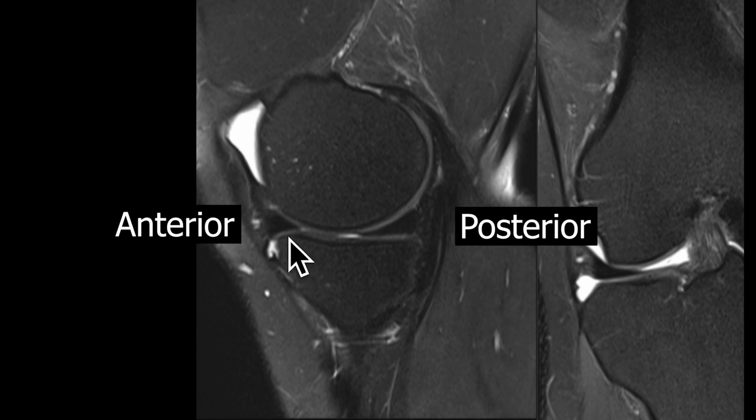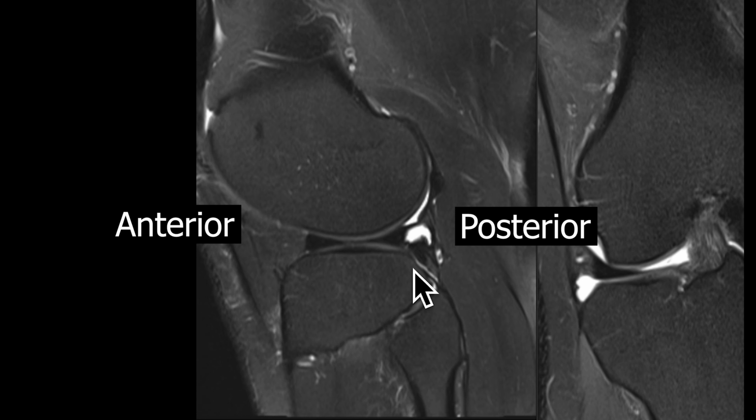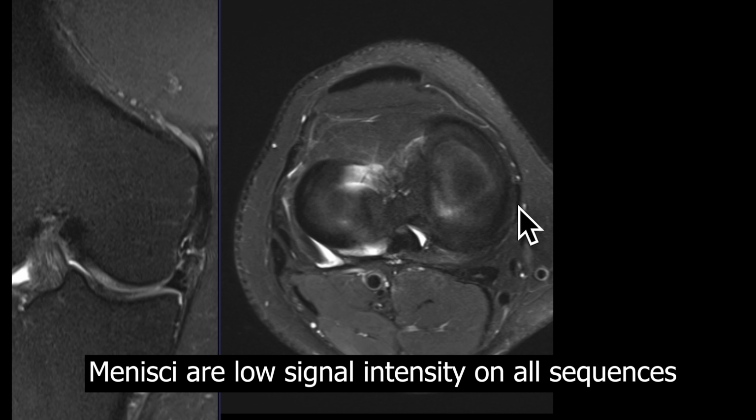The posterior horn of the medial meniscus tends to be larger than the anterior horn, whereas if we move on to the lateral side, the anterior and posterior horns are of similar size. The menisci are comprised of tightly bound, highly organized collagen fibers. These can be arranged in a longitudinal fashion extending from front to back, as well as in a radial fashion extending from inside to out. So your longitudinal fibers will run in this way and your radial fibers will run in this direction. This organization means that a normal meniscus will have very tightly, highly organized collagen and therefore will be of low signal intensity or of dark signal intensity in all sequences.